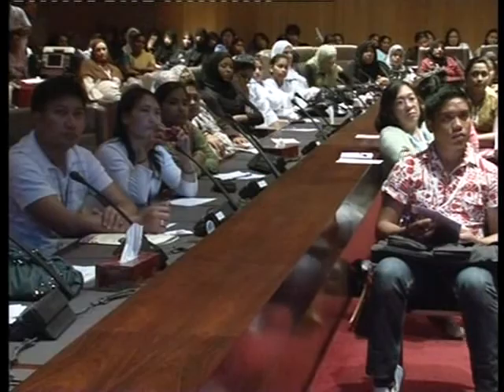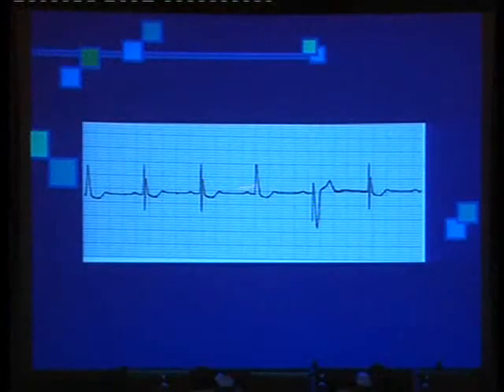So here, there is no problem with this pacemaker. This is a normal function of the pacemaker. But if you look here at the intrinsic complex and this pseudo fusion beat, they are similar, but we only have a spike here. This brings to our attention, so what is the difference between a pseudo fusion beat and a fusion beat?